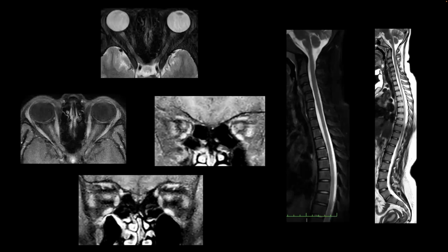Post-contrast optic nerves, not so much on the axial section, but the coronal sequences demonstrate some areas of enhancement in the bilateral optic nerves, predominantly in the intra-orbital segments. Spinal cord screening did not demonstrate any lesions. Was this correlated on fundoscopy for optic neuritis by any chance? No, sir.